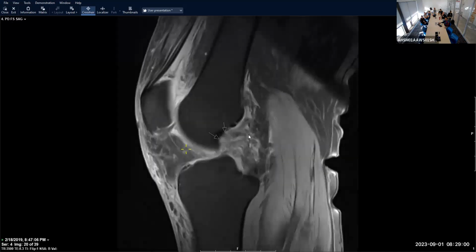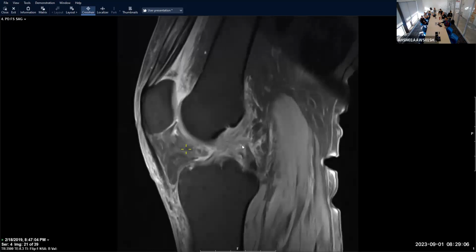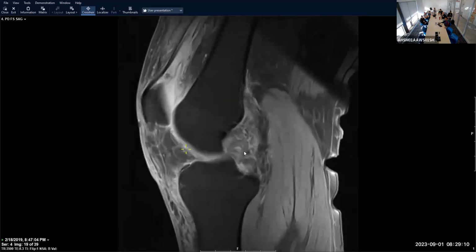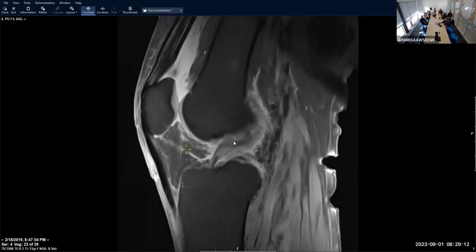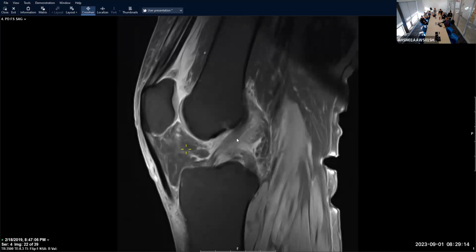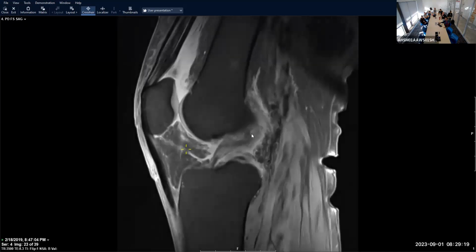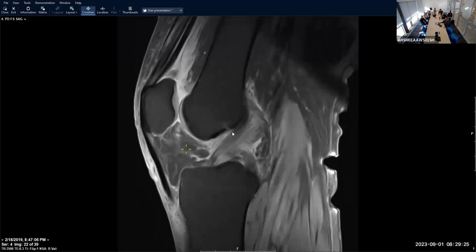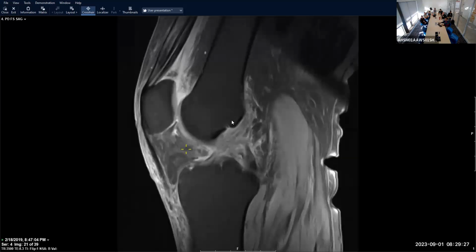Dashboard injury is the common cause. We can see here PCL. It's never really making it towards the condylar attachment. It's very bright, which is very abnormal for the PCL. It's normally homogeneously low signal intensity. ACL is kind of bright too, but we see some hyperintense ACLs. We see a lot of myxoid degeneration of ACLs or mucoid degeneration, but less commonly do we see mucoid PCLs. So this is a full thickness PCL tear from the femoral attachment.